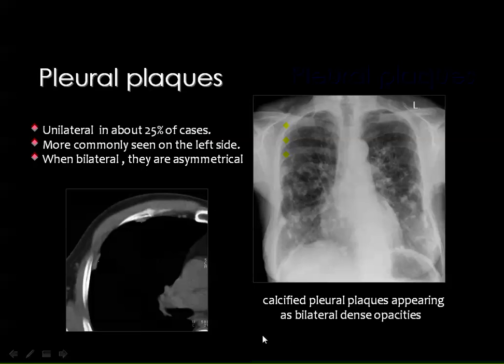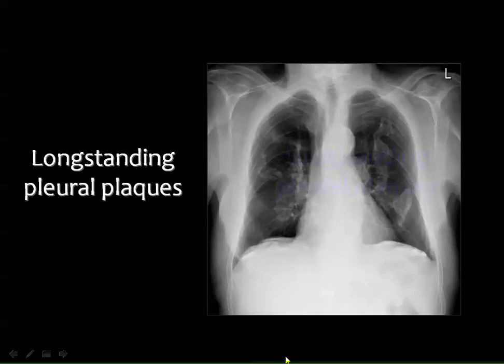Then whenever you have the CT scan, you can see the pleural plaques as areas or foci of relatively thickened pleura, which is not continuous but interrupted with normal pleura in between, and these plaques may be calcified and may be uncalcified. Then this is one of the clear-cut radiological findings of pleural plaques, and the clue here is the surface of the diaphragm.